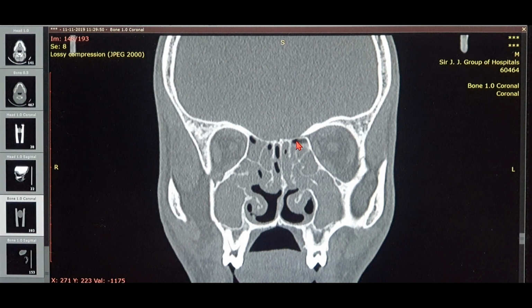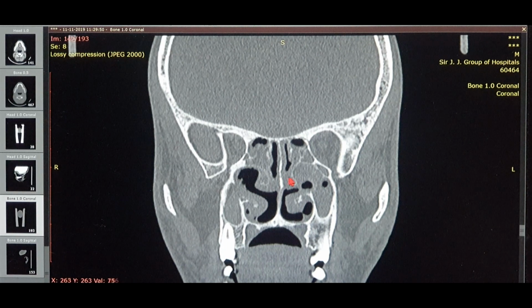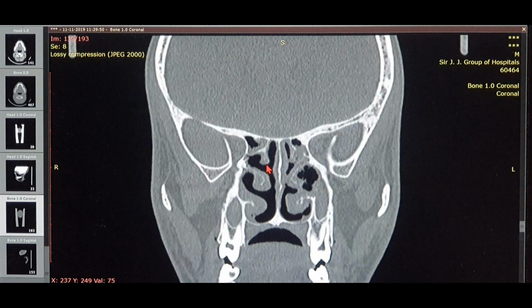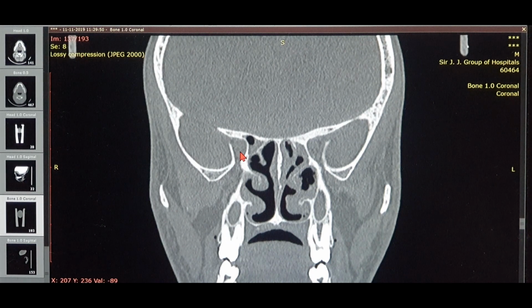So we covered the NLD, we covered the anterior and the posterior ethmoidal artery. Now the examiner may ask you, if you keep on going behind, if he wants to ask you a difficult question just to confuse you and scare you, so that you start getting tremors. To prevent that, I'll help you over here. So the next question, he may ask you, what is the rostrum, or localize the rostrum of sphenoid. Or where does the sphenoid actually start, and how can you identify that the sphenoid sinus has started.